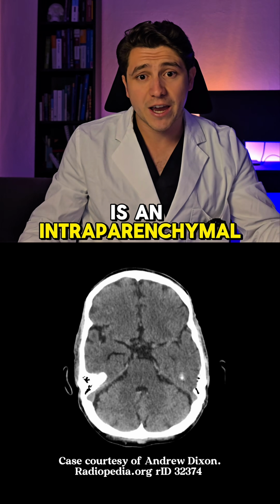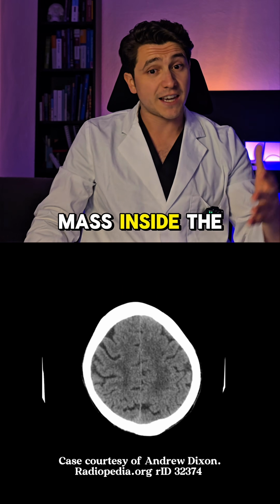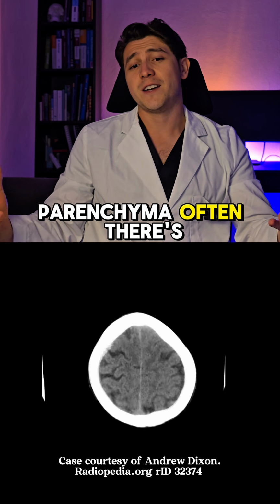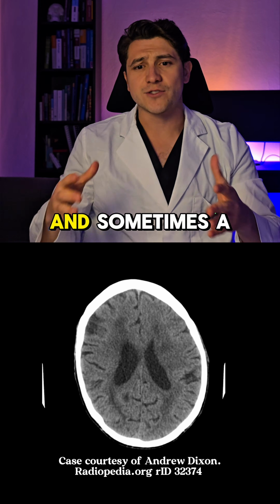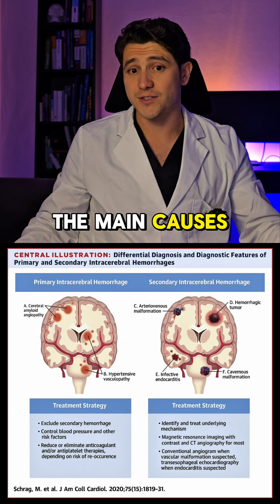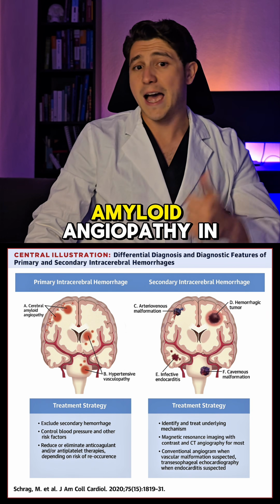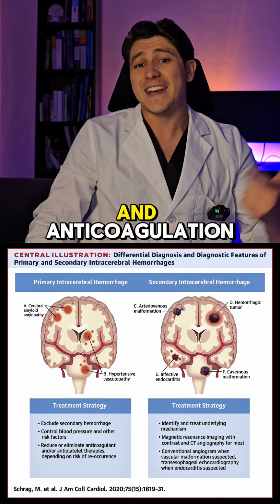This is an intraparenchymal hemorrhage. On CT, it appears as a bright hyperdense mass inside the brain parenchyma. Often, there's surrounding dark edema and sometimes a fluid level if the bleed is active. The main causes: hypertension, especially in the basal ganglia, thalamus and cerebellum, amyloid angiopathy in elderly, and anticoagulation.